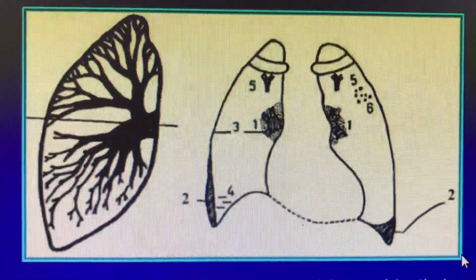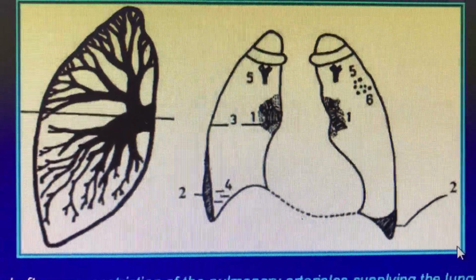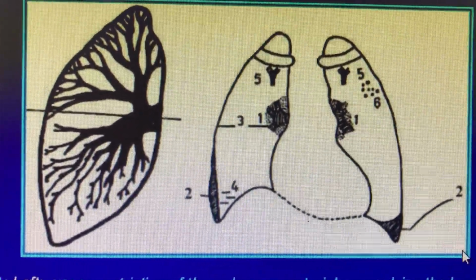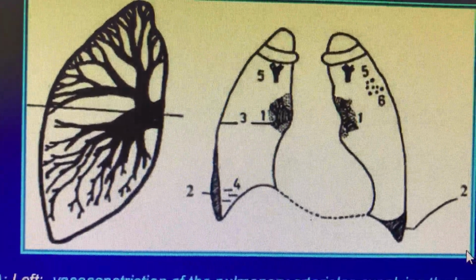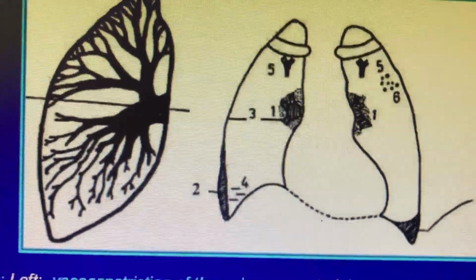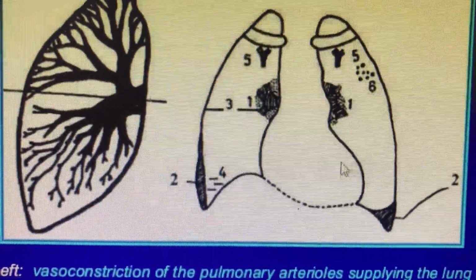So we had already discussed congenital heart disease and how the pulmonary arterial dilatation and plethora will be affected in the left to right shunt. Another part of cardiology is rheumatic heart disease and congestive cardiac failure because of LV dilatation. LV dilatation, in turn LA dilatation, and it is always the LA pressure increase which will cause the retrograde venous congestion and the pulmonary venous changes that we all see here.